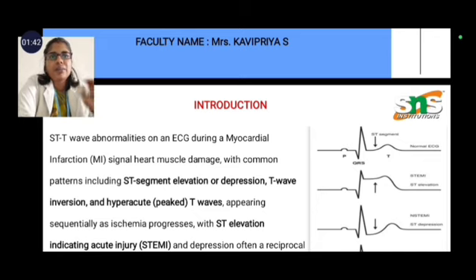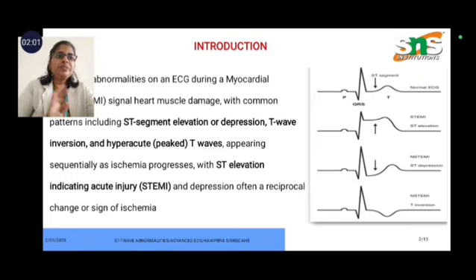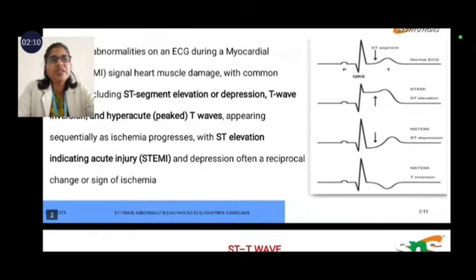Here the ST segment abnormalities mean ECG changes during myocardial infarction. It is a signal of heart muscle damage, with common patterns including ST elevation or ST depression, T-wave inversion, and hyperacute T-wave. Here this is the normal ST segment. The second one is ST segment elevation, and the third one is NSTEMI. The fourth one is NSTEMI with ST T-wave inversion.